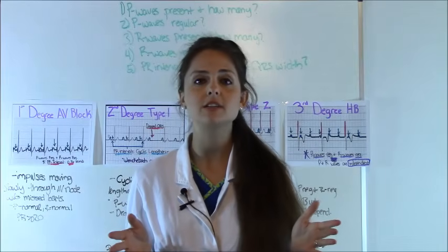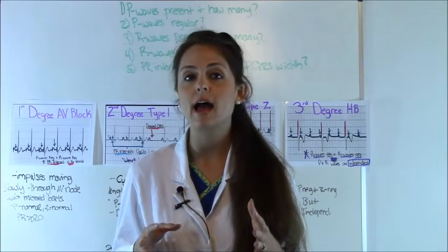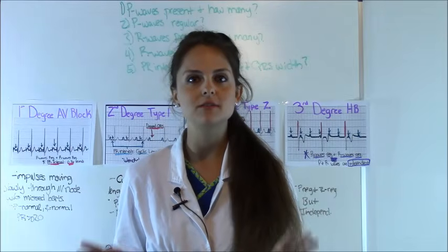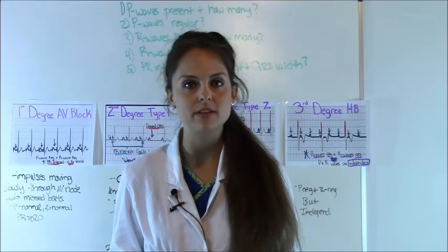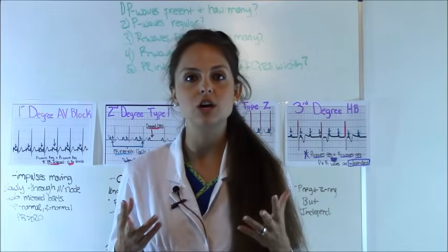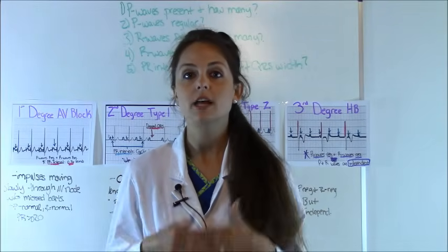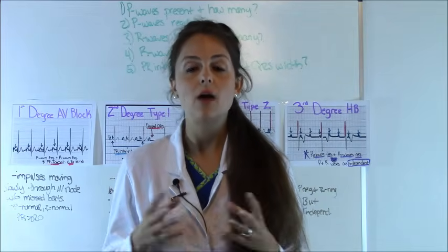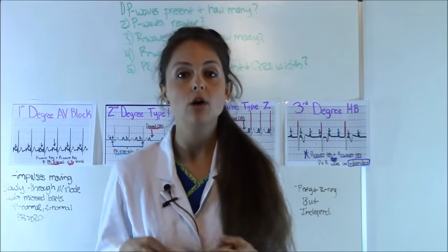I remember whenever I was in nursing school I had trouble telling the difference between second degree and 3rd degree. So here I have developed some easy ways on how to solve these rhythms, and they're little hallmarks, as I call them, because each rhythm has a certain thing you have to watch out for to make sure that it's the correct heart block.